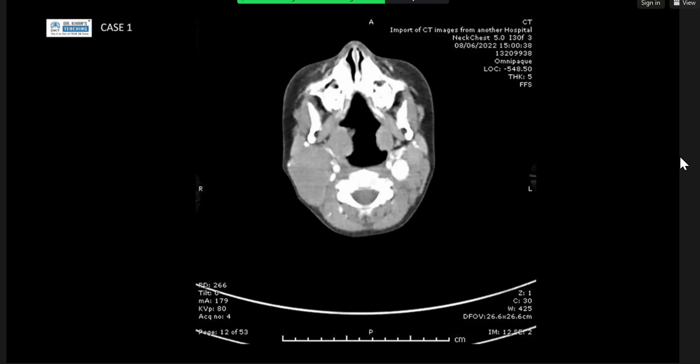Can I ask, what are your differentials again? Tell me your 3 differentials. Okay, for the first, this is a carotid body tumor. Second, glomus vagale. Could be schwannoma and neurofibroma, also enlarged lymphadenopathy.